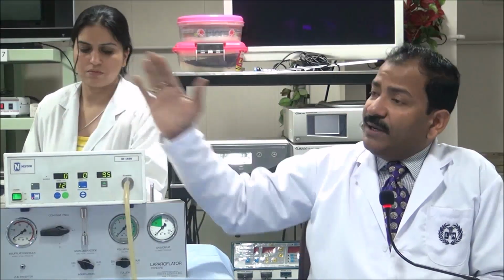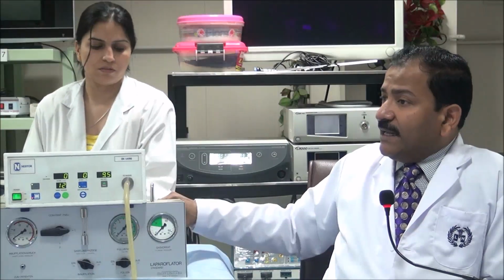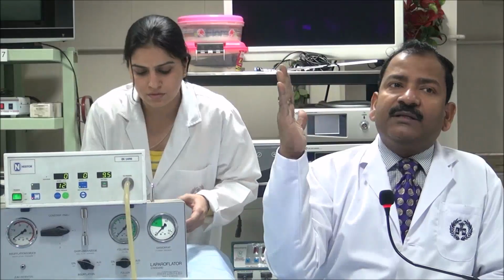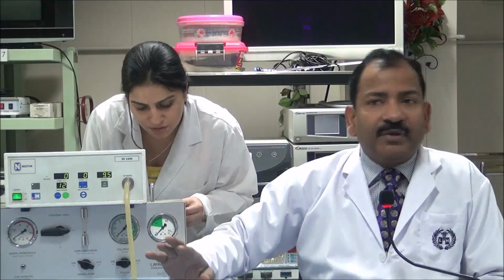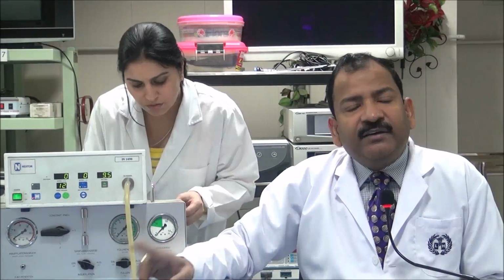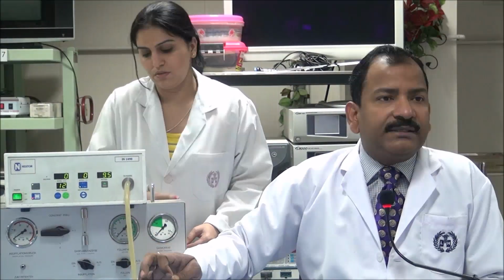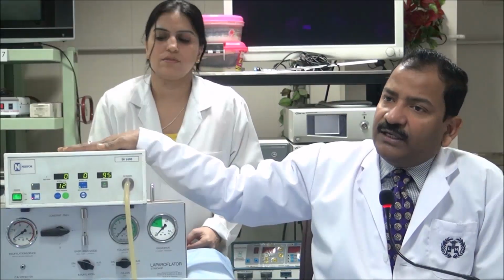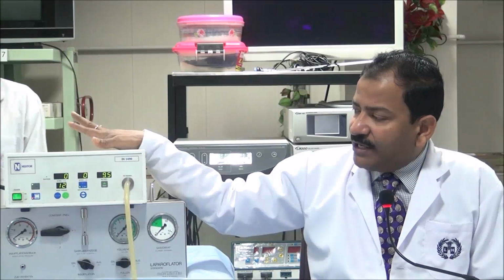If you keep it lying down, then here also, if you see the connection, it is erect, not lying down. Because if it is erect, the CO2 will come first and the liquid will stay down. Not only that, after repeated filling of the CO2, some water enters into the cylinder because of humidification. And if it is lying down, that water enters your insufflator and it will get spoiled. So that's why it should be avoided.